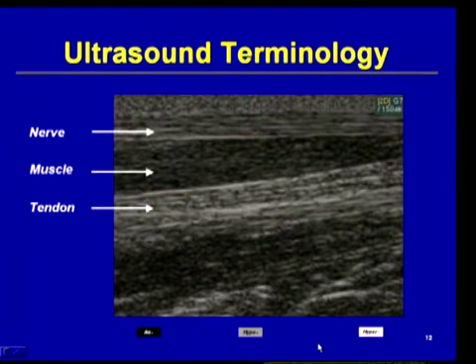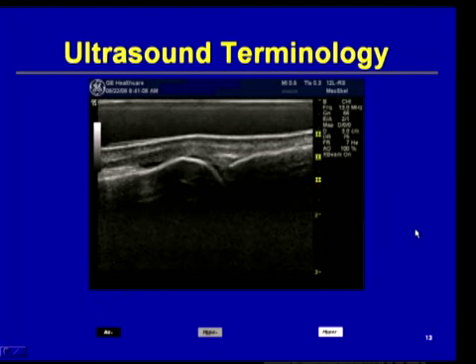For example, here is a structure going from the subcutaneous structures superficially, looking at a pattern that we see in a nerve, the hyperechoic signal. We see a muscle, and then we see some tendons. And I will show you all of these things in detail. But again, going from anechoic, hypoechoic, and hyperechoic. And this is another pattern that you will see.